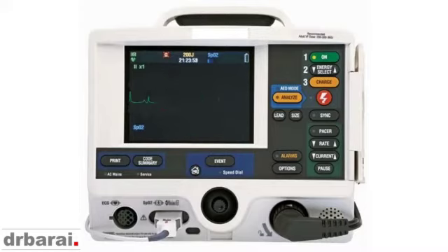Now this is a very interesting patient I saw a few months ago. This patient has got recently diagnosed lung cancer. The patient was brought in with shortness of breath, quite hypoxemic, tachycardic, and blood pressure was low. When we connected the patient to the defibrillator machine, this is the rhythm that was picked up. If you carefully look at it, there is a P wave followed by a QRS complex, a P wave followed by a QRS complex, a P wave followed by a QRS complex. So this is sinus rhythm, pretty regular.